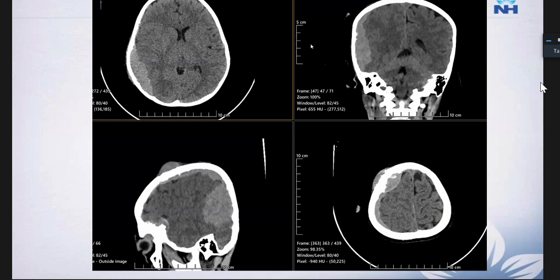What you can see is that the density appears very homogeneous and is not that hyperdense. If you expect an acute hemorrhage, we would expect a more hyperdense appearance. Of course, depending on the stage of the bleed you can have variable density, but there was no fluid level. It was a lobulated soft tissue density, slightly hyperdense, causing compression of the underlying parenchyma. The other thing is that it was crossing the suture, and if you look carefully there's a soft tissue bulge outside also. In the right frontal area the bulge is seen on the outside, and the underlying bone appears very irregular with jagged margins.